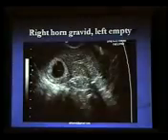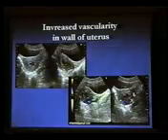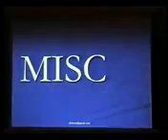Small, dead fetus, small fetus, large sac. This was the right horn was gravid and the left was empty. Increased vascularity in the wall of the uterus in cases of molar degeneration.